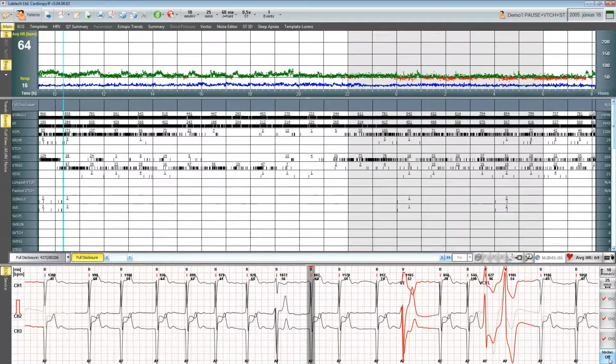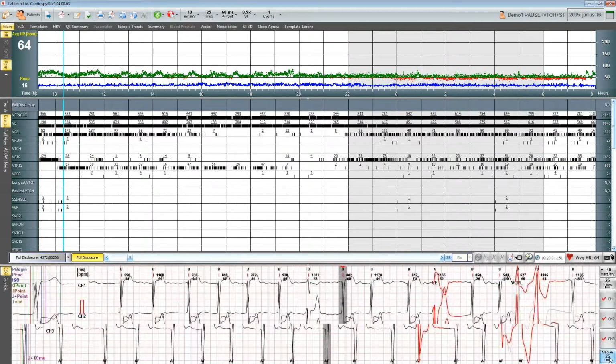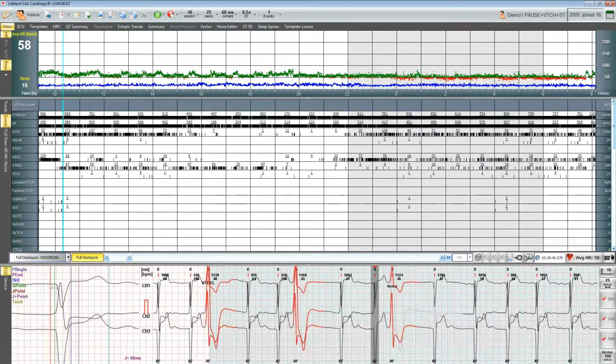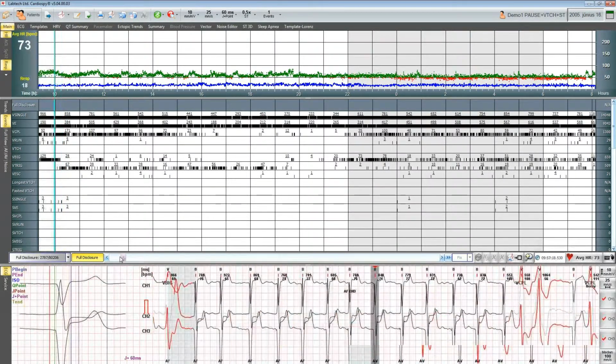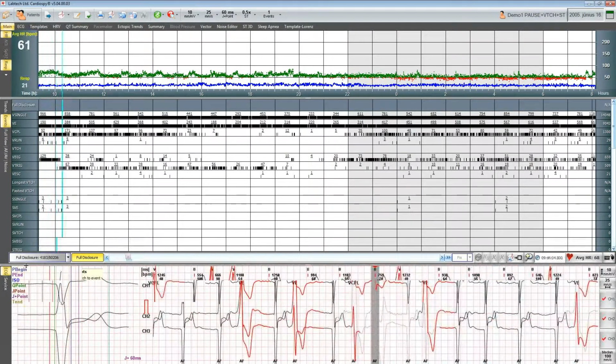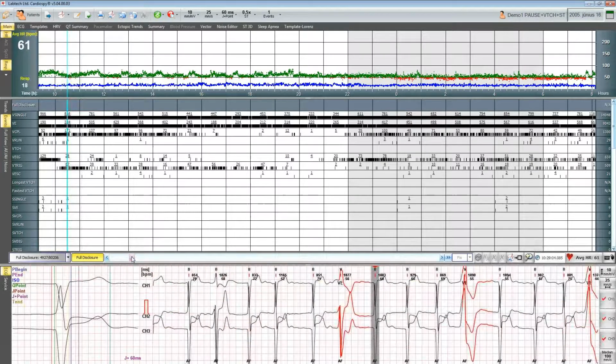One thing I would like to show you before I move on is the median SA-ECG, where you can see where the P wave begins and ends, and where the Q wave and the T wave are. So you can also see if the P wave is missing from the ECG, like if the patient has a flutter where the P wave cannot be detected because there are multiple waves that could be detected as a P wave, you won't see this marker. The P wave is missing now.